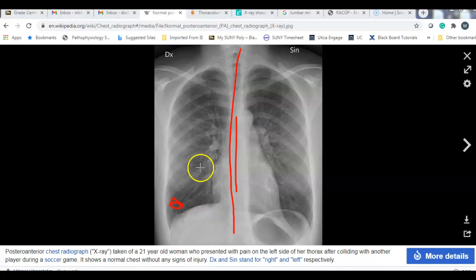that all the ribs look clear and good. You could look at the clavicle. Oops, sorry, this would be the clavicle. This would be the scapula here with the spine and the scapula. Sorry about the drawing. So bones, you want to look at the bones. You can't see them as well on this x-ray. Cartilage you can't see as well. You see that a little bit more on the lateral chest film or thoracic.